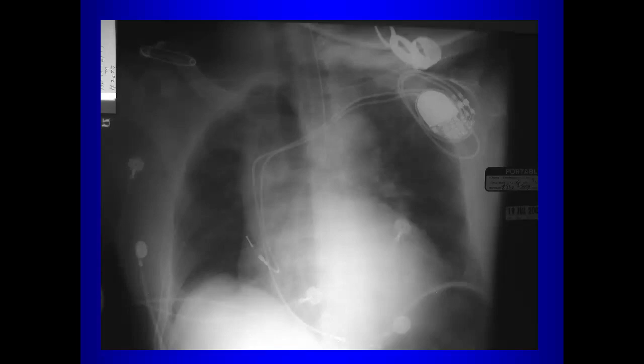It just looks large. I think maybe the displacement of the trachea, suggesting that Actually, it's because the patient is rotated, which actually works out well in this particular case. The patient is rotated there towards the right side, so that shows you the trachea over on the right side, but it's from patient rotation.